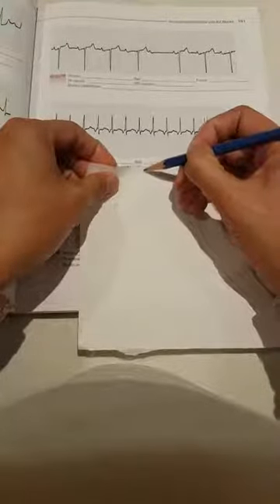Okay, so what I'm going to do, as I did last time, is I'm going to fold the piece of paper to line up those hash marks, crease the paper, okay, and put an arrow or another hash right where the crease is. Okay, and I'll do that here as well.